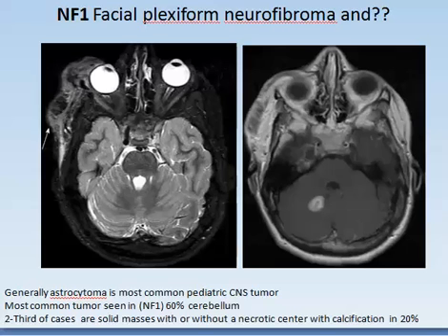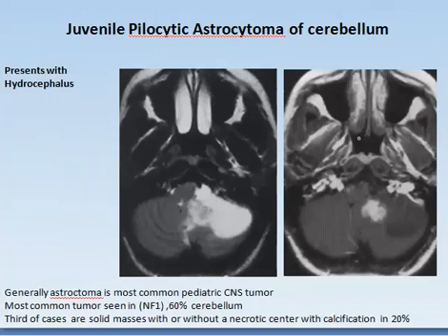One third are presenting as solid masses, in neurofibromatosis and tuberous sclerosis usually. The rest are appearing as cysts with mural nodule, which are enhancing intensely. This is what they call pilocytic astrocytoma of the cerebellum, but here it's not in the midline.